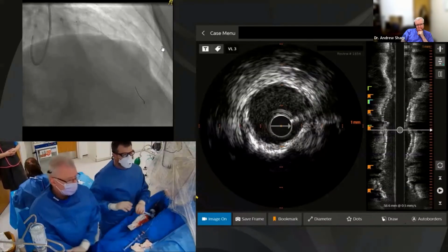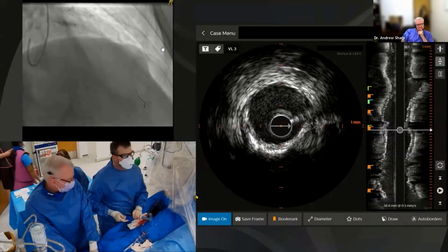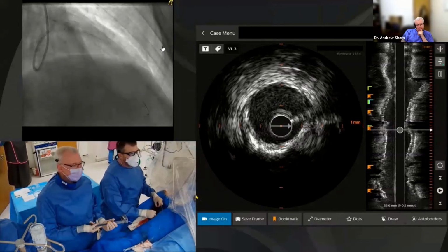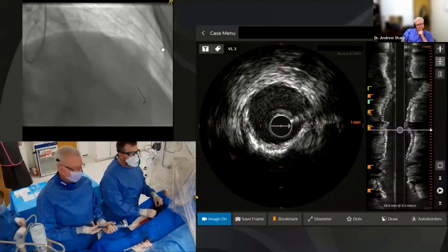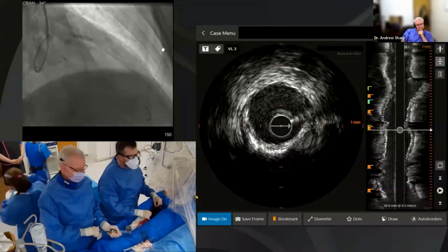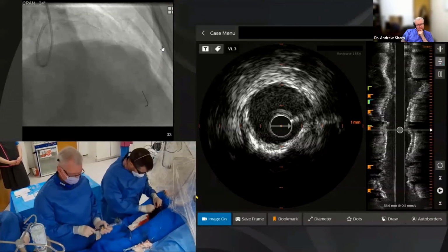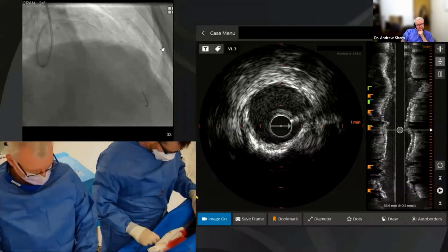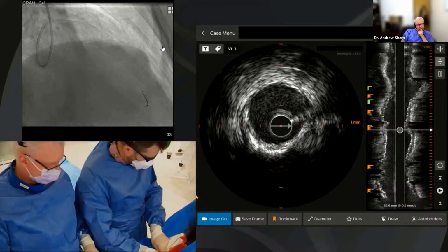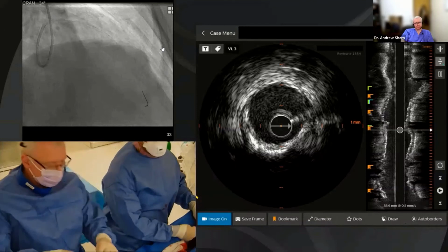So we've met the second rule of Ultimate for stent optimization. Has to be over 5 or 90% of the distal reference. So we are meeting that here. Just go there. Just go to 10 there. 10. That's fine. And down. Yeah, and down. And then let's have that 4.5. Okay, and then there's the 4.5.